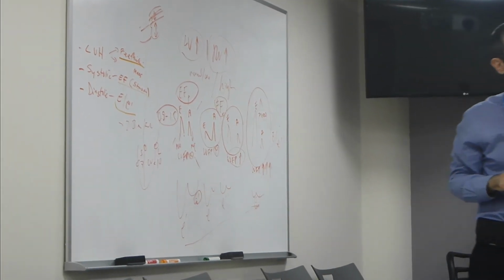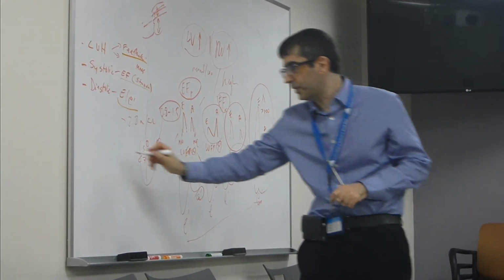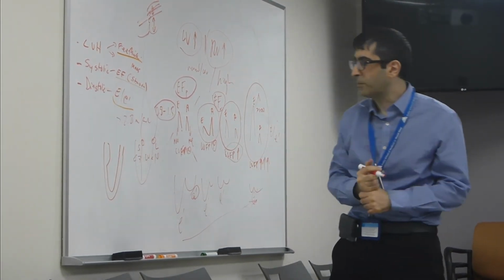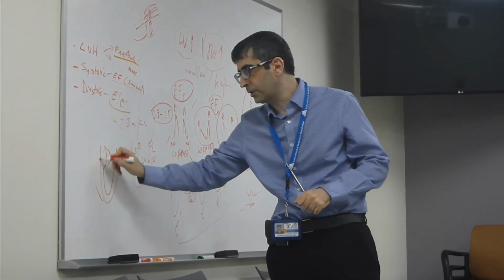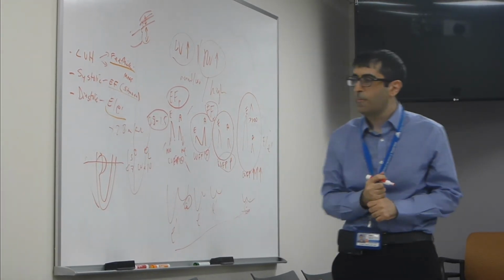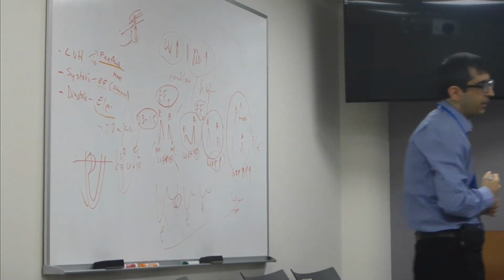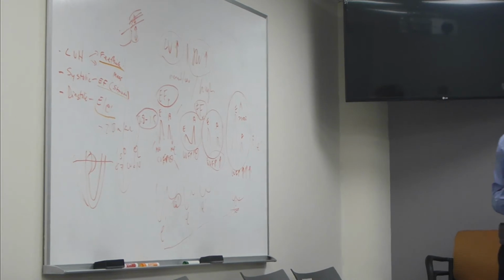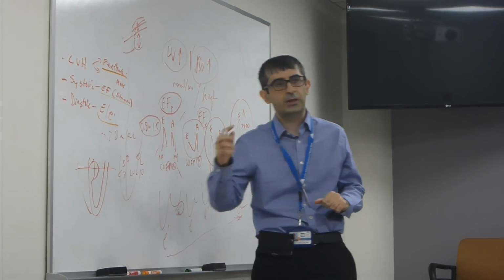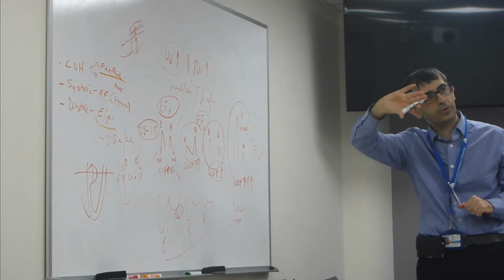The problem with it is that as you get older, your septum, you've probably seen this, gets more sigmoid, right? So you'll have something like this, if you look at the, let's say, apical view. Your septum will be thickened in this portion, and when you look at the parasternal view, again, this part will be thickened. This is part of normal aging when your septum gets more sigmoid and thickened. So many studies, when they used thickness, specifically measured the posterior wall because it doesn't get affected by aging as much as the septum, which gets bulged and sigmoid.